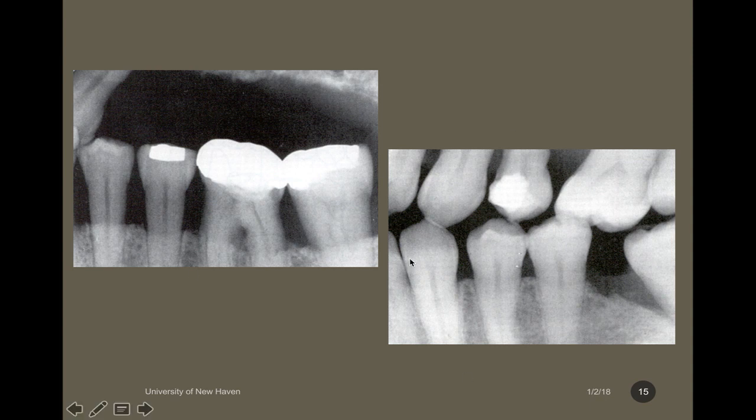When I look at this image here, a few things go through my mind. So I would say, looking at these mandibular teeth, when I look at 20, 21, and 22, it looks like I might have the start of some bone loss, so maybe some mild, maybe case 2 bone loss here. But then when I look over here, I have this huge, more severe bony defect. So I definitely can say here I have a localized bony defect, a localized, more severe periodontitis, with more generalized case 2 mild bone loss.